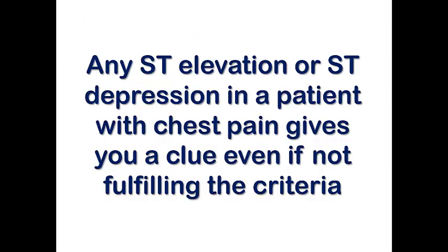And our tip near the end of the lecture: any ST elevation or ST depression in a patient with chest pain gives you a clue, even if not fulfilling the criteria. So please, when you analyze the ECG of a patient with chest pain, pay attention to any ST elevation or ST depression in any lead, whatever the magnitude.